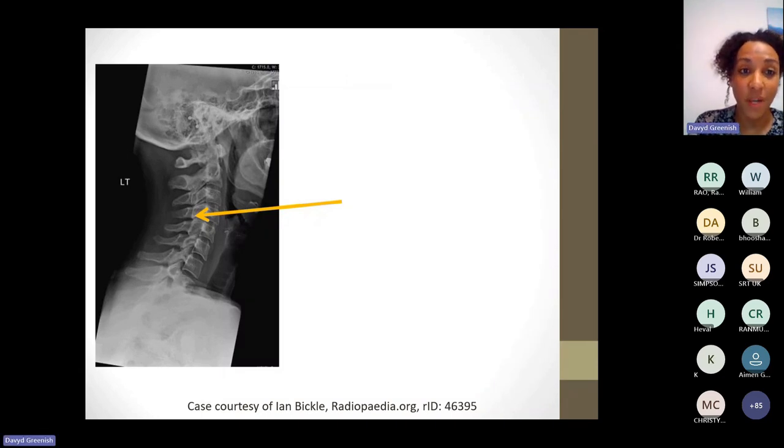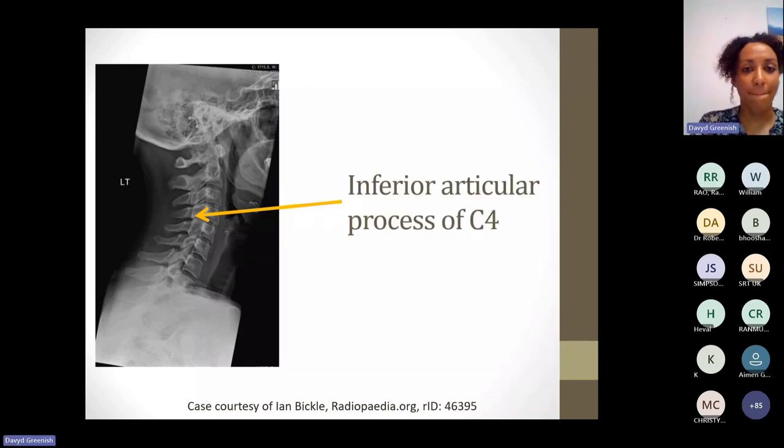This looks like it's exactly the same question, but it's not. I hope you can see that this is actually pointing to the bone, and it's pointing to the bone in the inferior part of the vertebra there. So we're at C4. So this is the inferior articular process of C4, because we're specifically pointing at the bone. And another point to make, just exam technique, is don't try to side these. I think it's impossible to say what side that we're pointing at, but do put the level, because I can clearly see that this is C2 here. So I know that this is C3, and I know that this is C4.